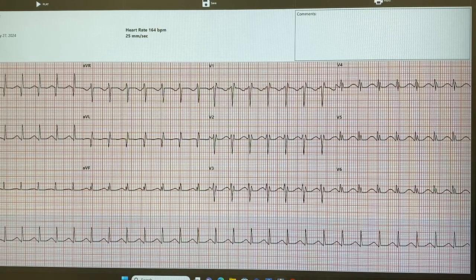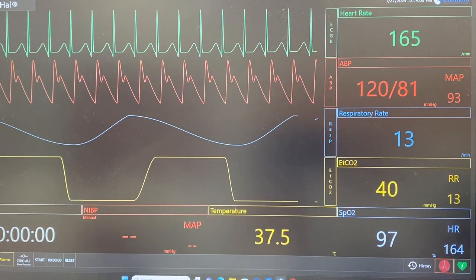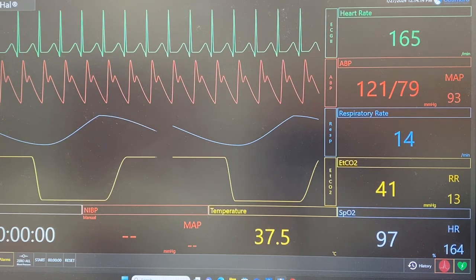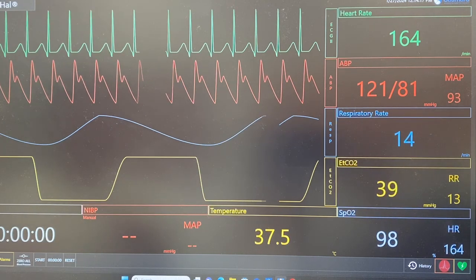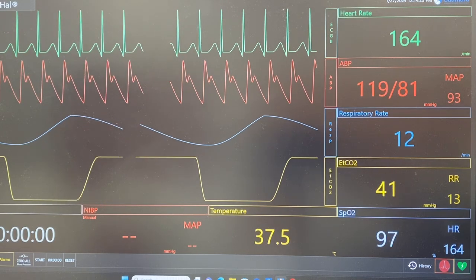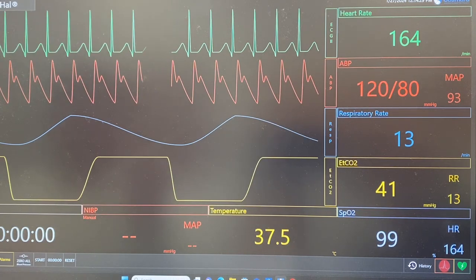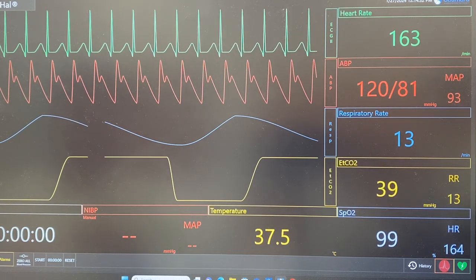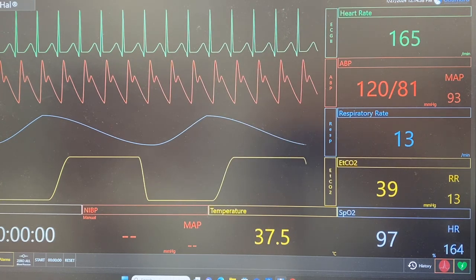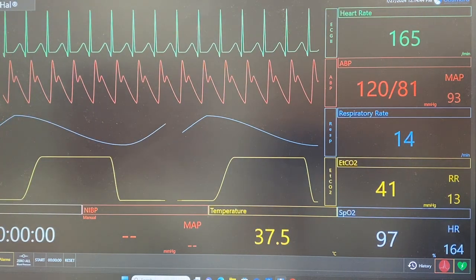Go back to the telly now, because I think you get a better view there. The first positive wave is the P, the second is the R, and the third is the T. Those are the 3 positive waves. How many positive waves do you see? 2. So meaning 1 is missing, and the one that would be missing first is the smallest, which is the P. So there's no P wave. Those are T waves.